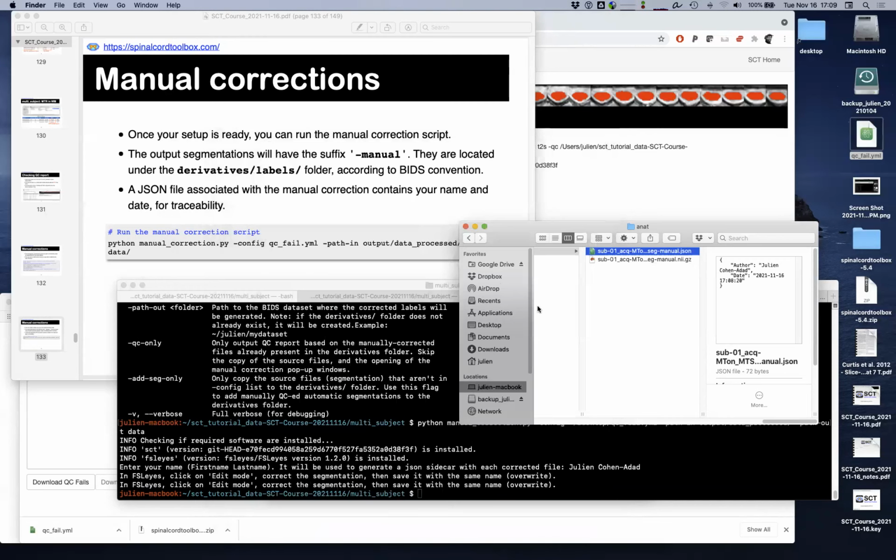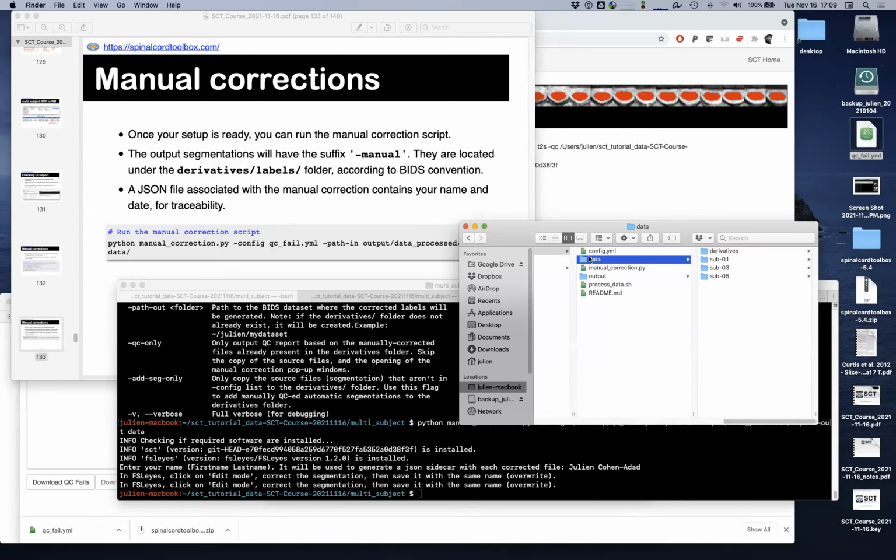Okay, and now you can take this entire data folder, zip it, package it, and share it with your friends, family, and so on. Or you can also put it on GitHub, update the version, the release of your data set. And now you can version track exactly the data set you used to generate a particular set of results. Right?